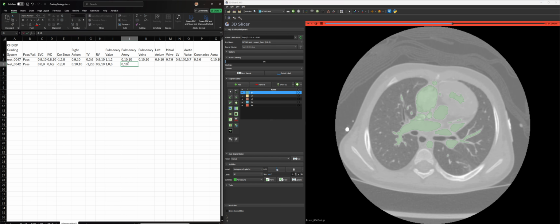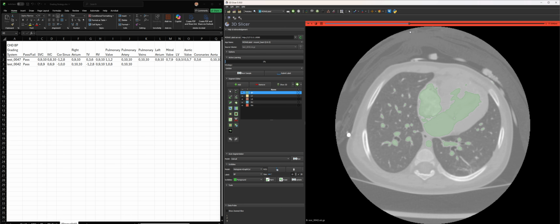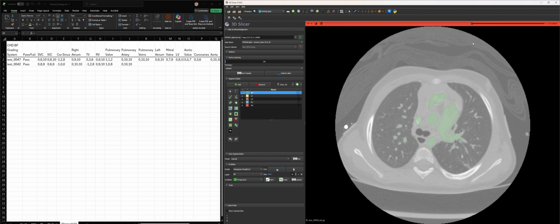0, 10. And what's interesting is I'm finding that the right ventricular side is much different on these congenital cases compared to the adult 4D cases, which we should expect. But we may find some differences there. So now we're looking at pulmonary veins.